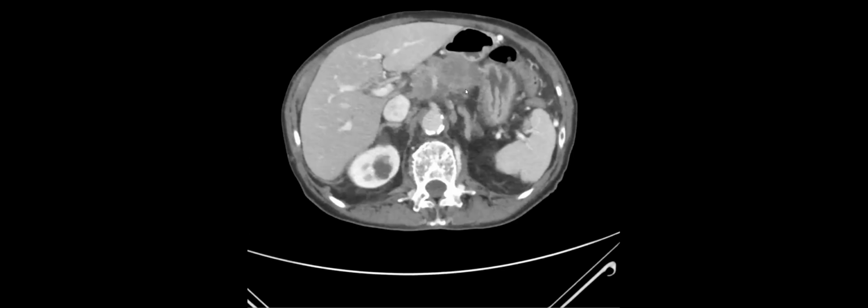Lymphoma tends to encase vessels. But is there vascular invasion anterior to the portal? I think it's just right there, pushing centrally, but maybe that's just nodular tumor. I do want to bring up one thing: a few weeks ago we showed a lymphoma and we said it's too hypodense and all this stuff, but really aggressive lymphomas can be hypodense and they can even take out vessels. So we still kept that in the differential, some kind of aggressive sarcoma, some kind of neurogenic tumor. The clue is actually the calcs.